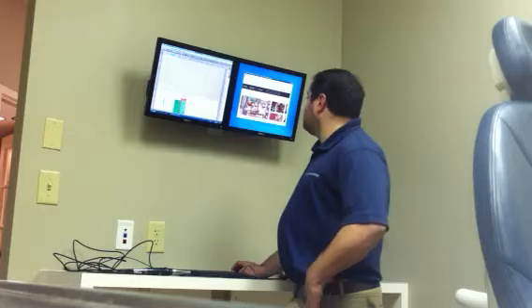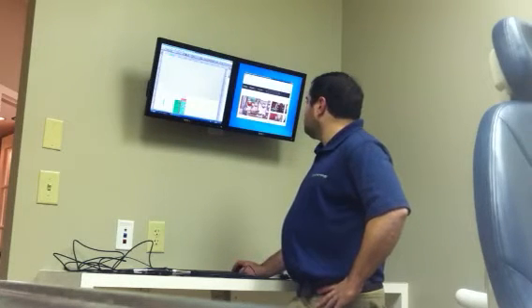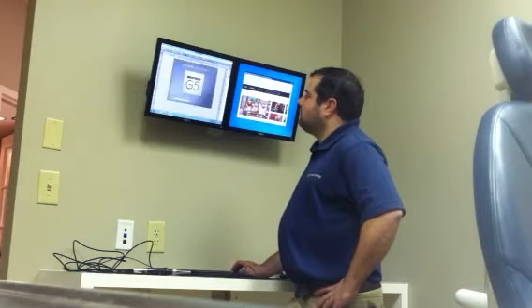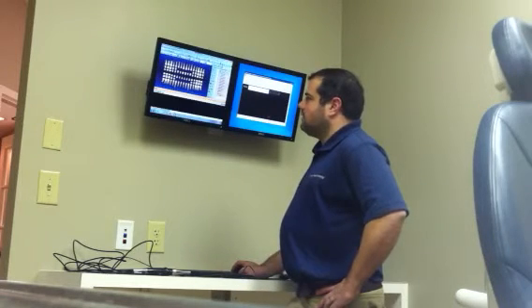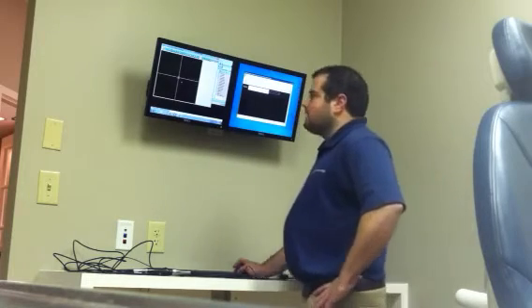I will go ahead and open up one of our patient records, and we will also launch one of the Hulu content selections right now. So I'll just go back to today's date, pick a patient off the schedule, and there we have our chart opened up with x-rays at the bottom. Go ahead and open up Dexis here.